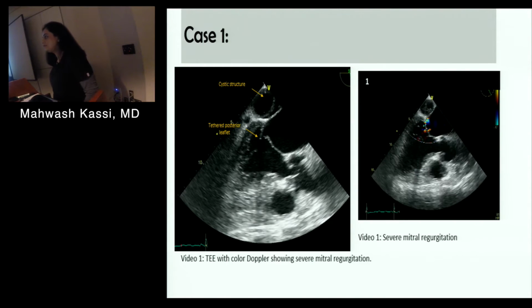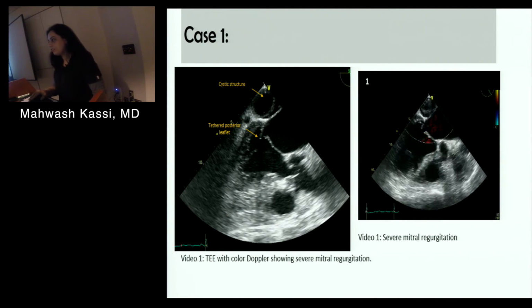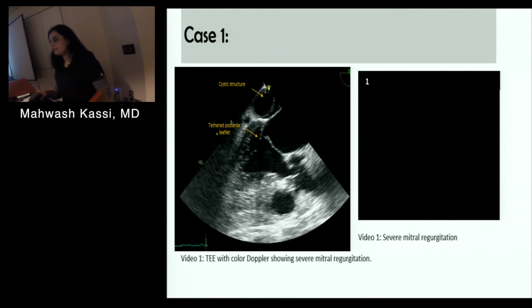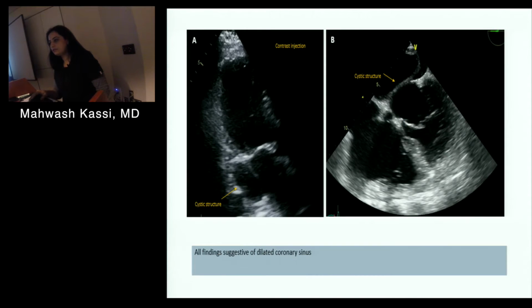I mean, I think in the end we decided basically that the echo was just not enough to tell us exactly what the structure was. Right. I saw the 3 other images, CT, MRI, everything else that happened. I was just curious, could it be? No, that's definitely on the differential.